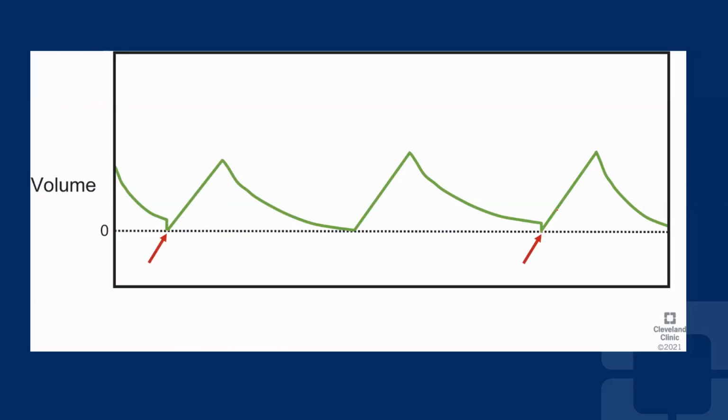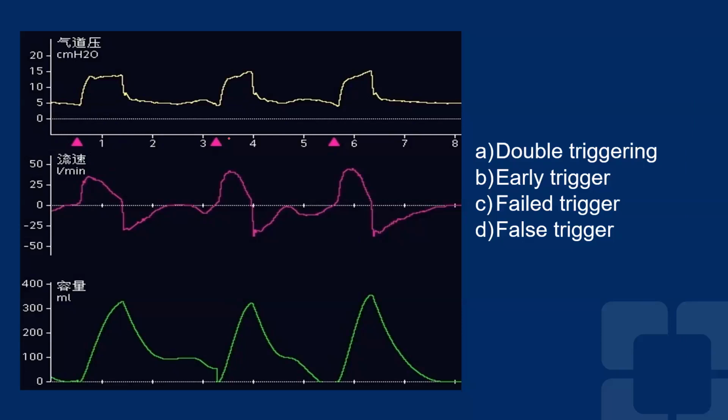You can see the pressure is being controlled throughout the breath. You see some aberrancies on the pressure because the ventilators don't control the pressure as well as they should. And then you see the flow, and during inspiration it goes up, then the patient exhales. And when the patient exhales, you see that it reaches baseline, and then the patient exhales again. It's more clear on the second breath. Again, the patient takes a breath in, triggers the breath, then exhales, shuts the breath off, and then you can see how the flow is going out, approaches baseline, tries to cross it, doesn't cross it, and again the patient exhales or relaxes, and then another breath starts.